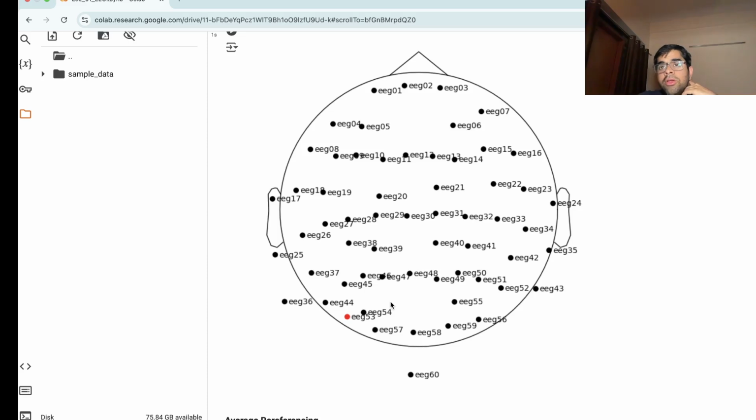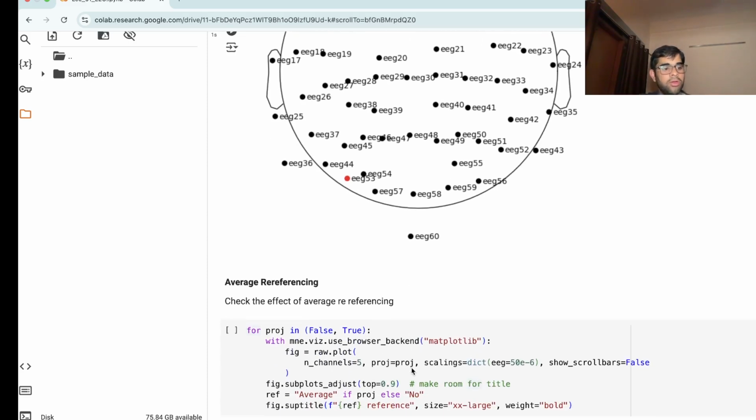a discharge happening from the visual cortex because of eye movements and visual effects also. So even the activity here can be captured using this electrode. So because of volume conduction, and we'll look into how to minimize it in the later classes, we'll see a small intro to volume conduction in this lecture also.